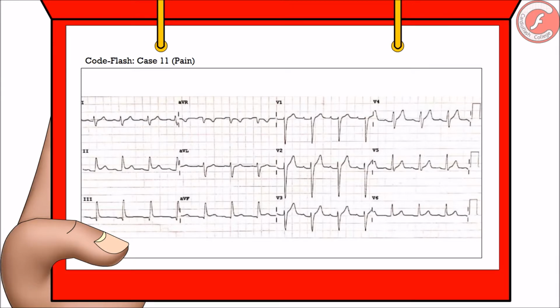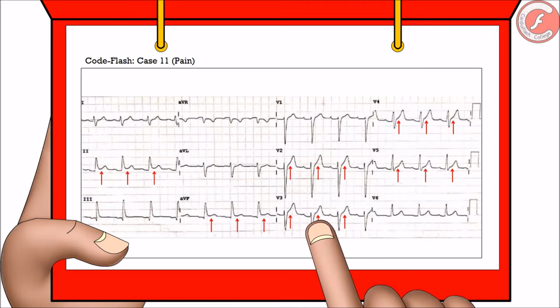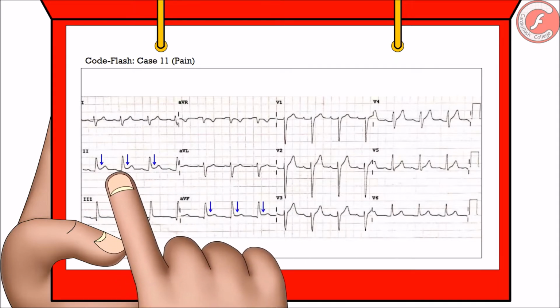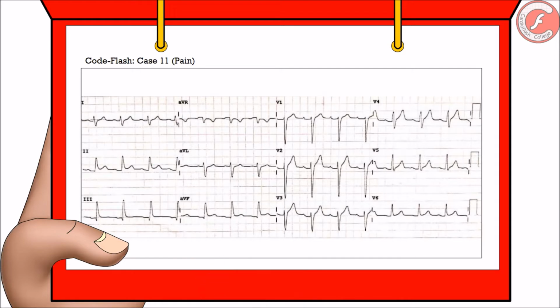That's it! There are at least 4 discrete but interesting alterations in this electrocardiogram. The first we can say is that the ST segment is elevated simultaneously in some leads. The second point is that such elevation has a concave aspect in some leads. Then we have to point out that there are no mirror images. And finally, it is clear that there is a descent of the PR segment in almost all the leads.